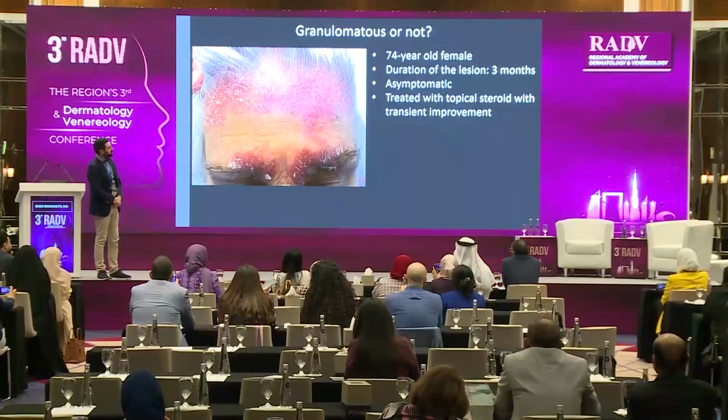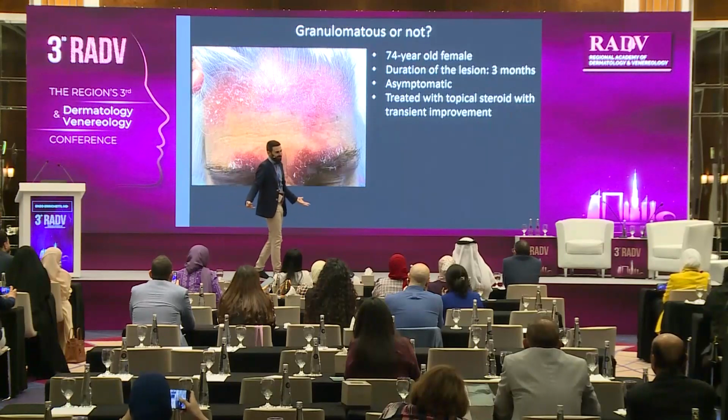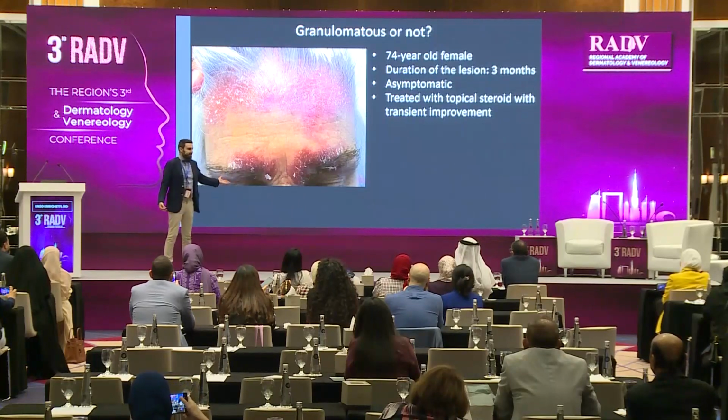This one. 74-year-old female, 3 months, asymptomatic, treated with topical steroids with transient improvement. Come on, this is psoriasis. No, this is psoriasis, come on. Lupus, pseudopsoriasis.